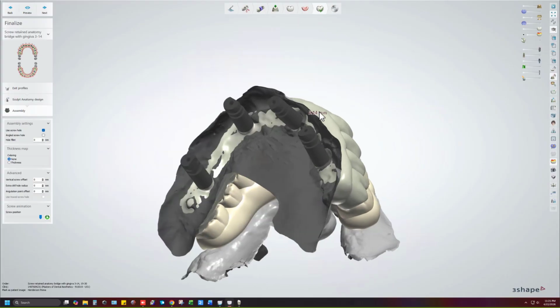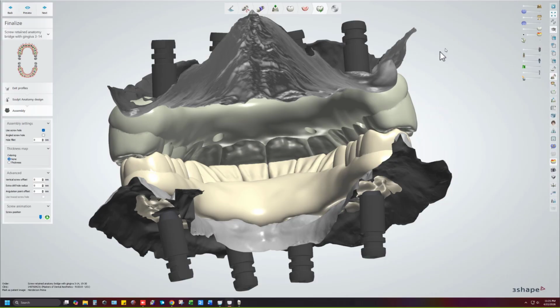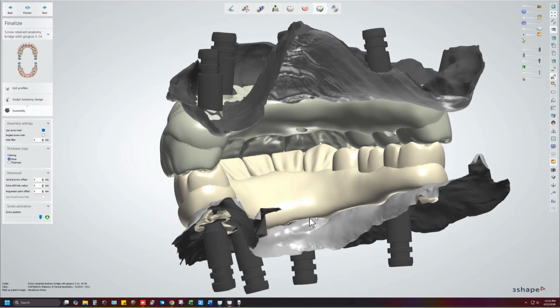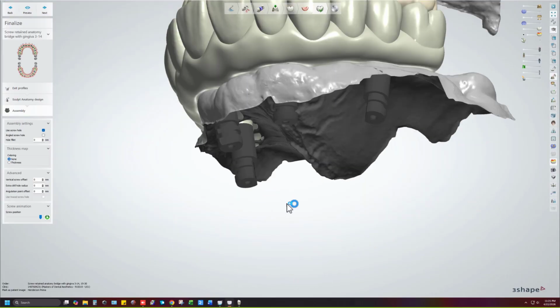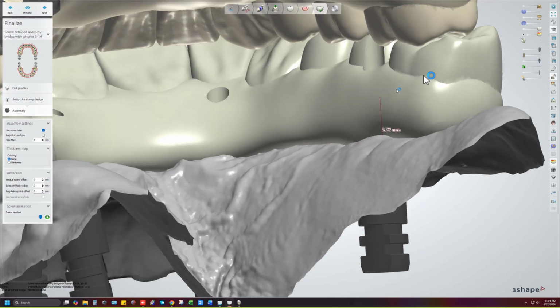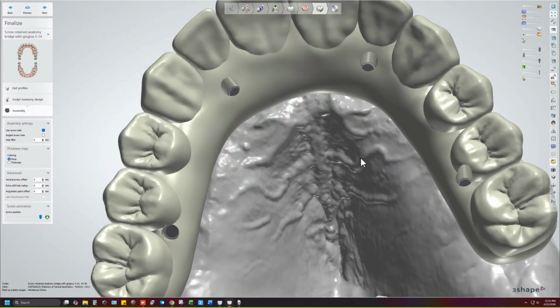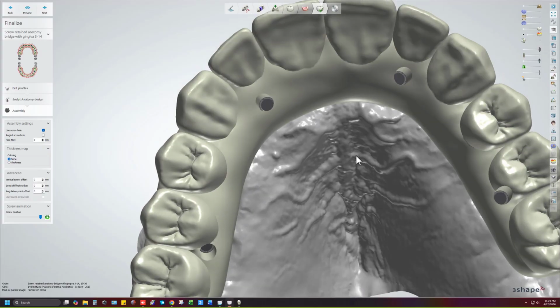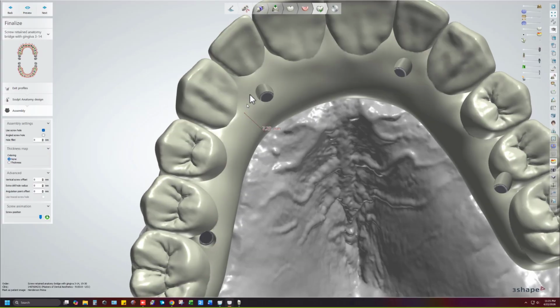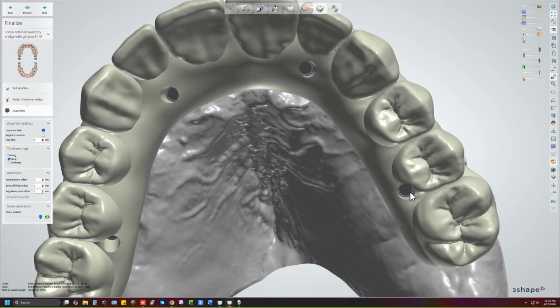Tissue pressure adequate. We rolled the lingual to open it up for cleanliness, and we did a little bit more right here, but you can see this is 0 degree, no angulation needed. Perfect right there. These two are perfectly fine. This one, I wish I could bring it somewhere else, but I think we're going to be okay.